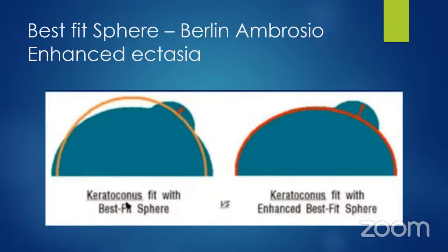See, cornea can have different shapes, right? So if, on the left hand side, I'm putting this kind of a best fit sphere, what will happen? This area will show that this is depressed, and the ectasia part, let's say it is showing plus X here, but that is a smaller value. So I may not think it is a really ectatic cornea, because a little variation always happens, right?